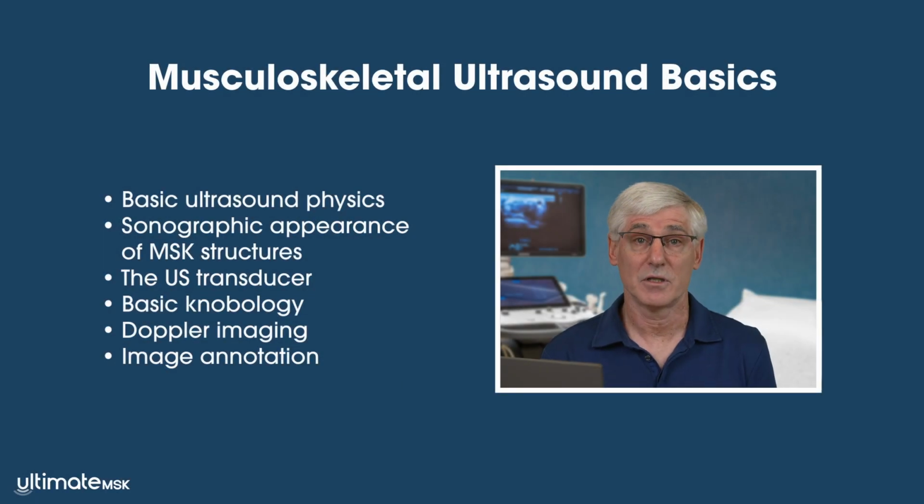If you're new to ultrasound, mastering the basics is essential for becoming a proficient sonologist. Small details such as properly holding a transducer or optimizing an image can significantly impact your ability to recognize structures in an ultrasound image or guide a needle during an ultrasound-guided injection.